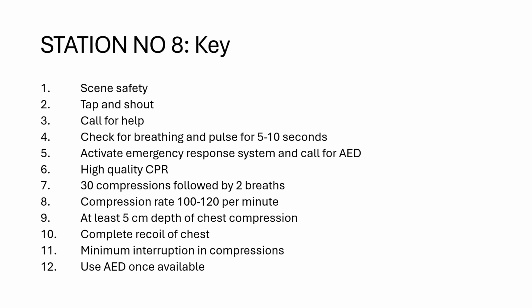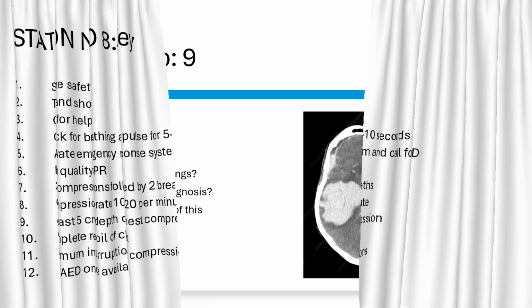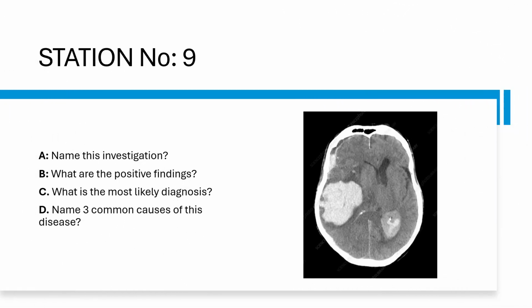Question number 9. We have a CT scan which shows an abnormality. Name this investigation, what are the positive findings, what is the most likely diagnosis, and name 3 causes of this disease. Please guys, look down at this CT scan.